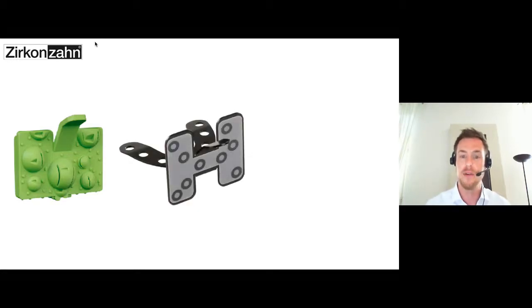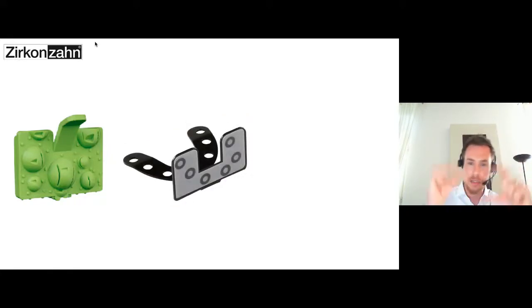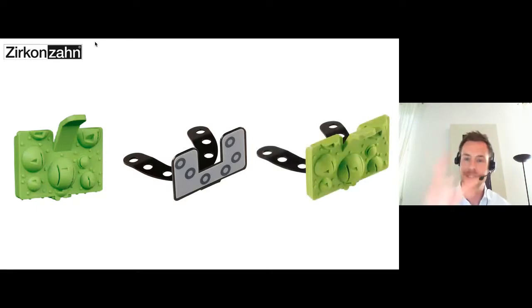But we have closed the digital circle by using this green piece you can see now on your screen. This green piece is called the cover. This cover will be placed on a newly designed type of fork. It's a little bit shorter. And this fork can still be used in a conventional way by using the scan marker, or we can slide the cover onto it. And now it's time to use the whole fork digitally.